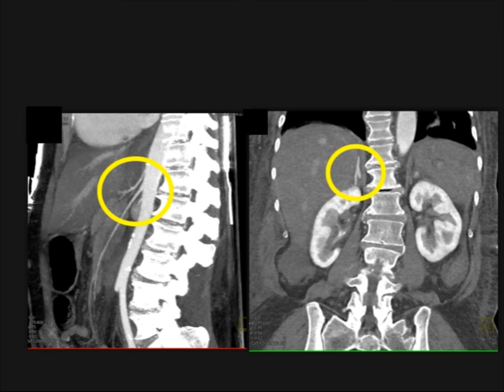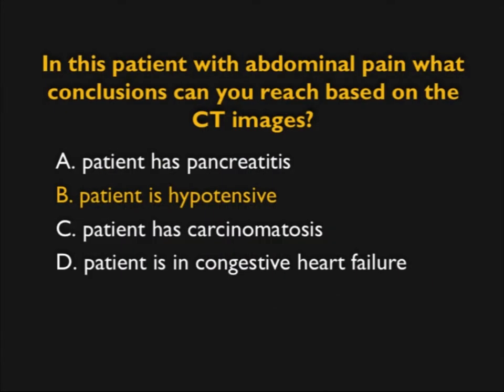If patients had poor cardiac output and had failure, I guess you're going to have poor flow. But at the end of the day, it's hypotensive. So again, I make the point that when you're looking for ischemic bowel and you see very tiny vessels, you better be thinking about that possibility. Again, the vessels are patent, but it's the vessel size that becomes most critical in this example, and very nicely shown on the images that are enclosed.